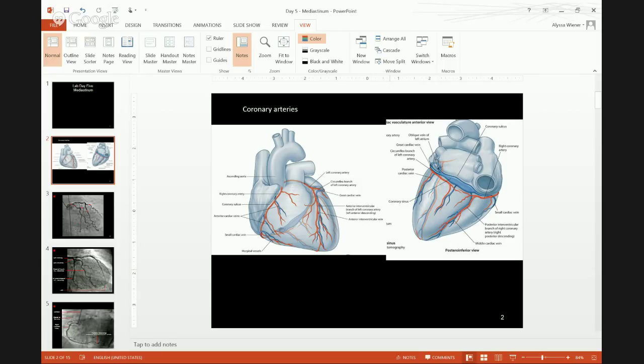This is a similar thing, which one is most anterior. Here it asks us to order it from posterior to anterior. I think it's a little easier to think anterior to posterior, but whichever way you want to do it works. So if we're looking for the most posterior image, we're not going to want to see a lot of heart. We're going to want to see the pulmonary veins plugging into the back of the heart. We're going to want to see the bronchi separating off. So just have a mental image of how all these structures lie.